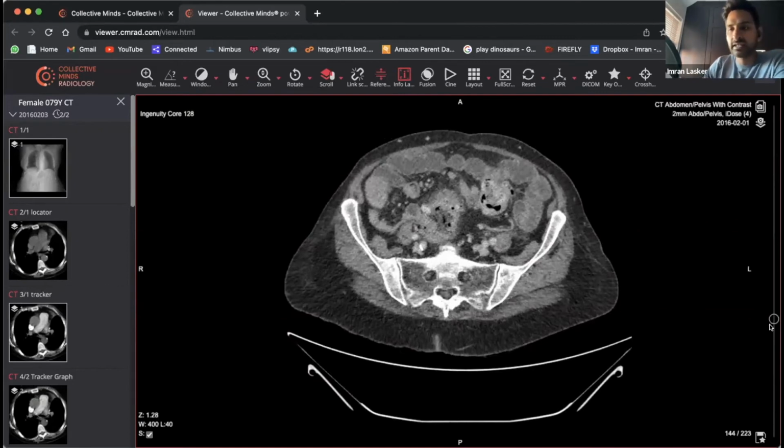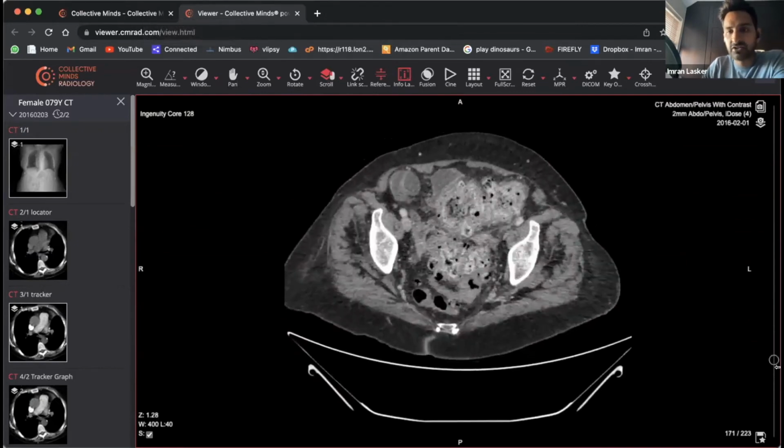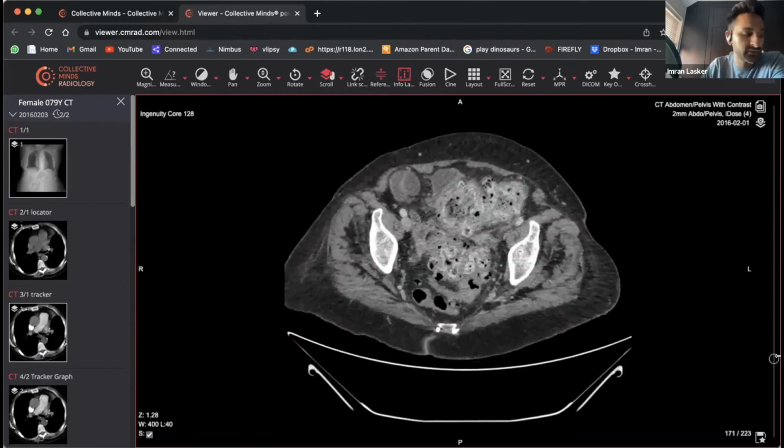What can happen to patients, usually if they are elderly, or someone said something, yeah, perfect, well done. Exactly right. So you picked it up, you know your stuff. This is exactly what you said, Stercoral Colitis. What can happen is that the fecal impaction, lots of feces just sitting there, can actually start resulting in inflammation itself. It starts to cause something called Stercoral Colitis, where you've got impacted feces within the colonic lumen and there's subsequent inflammation.